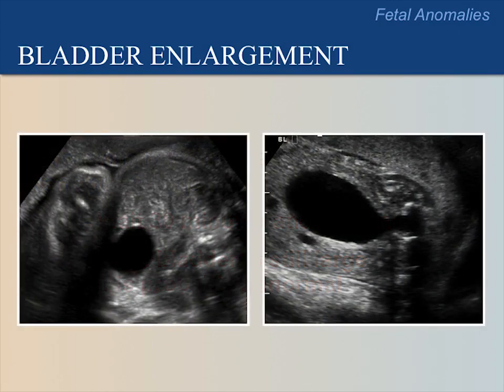Please pause the video now to look at these images as a group and ask what the structure is and whether it appears normal.